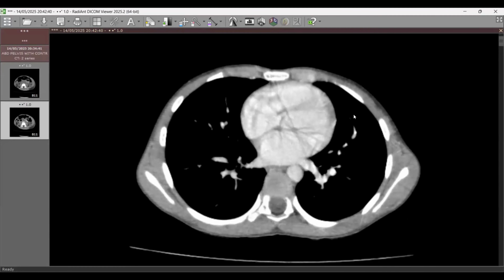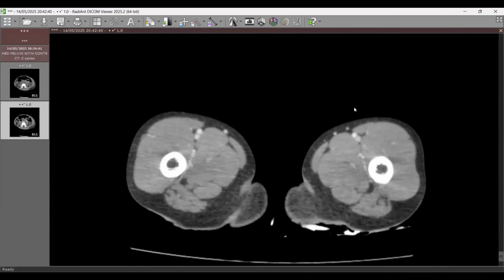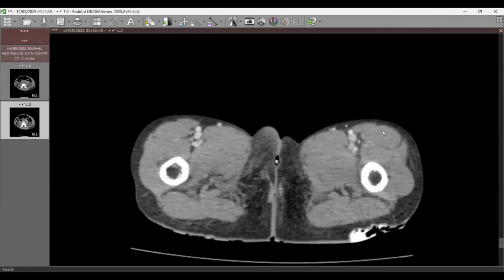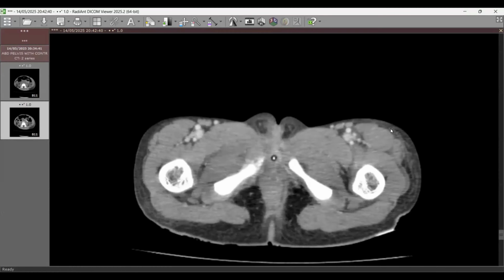Okay, so it's a little bit lagging. So I'm just trying to go to the area of interest.